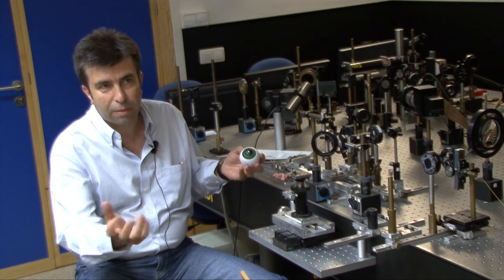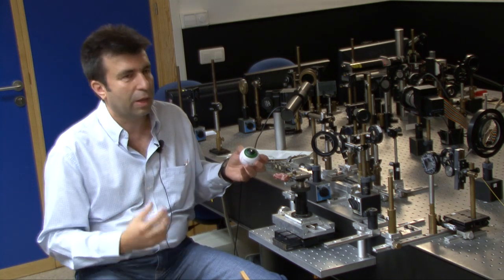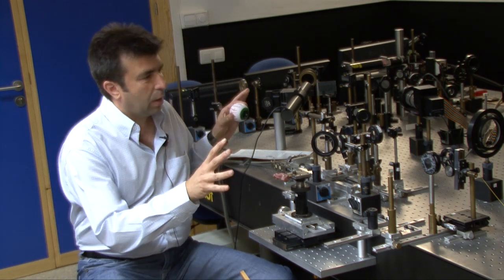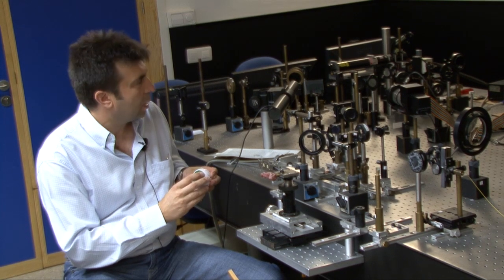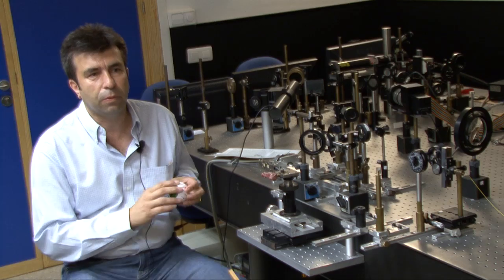Of course, you know how you are seeing, but how are other people really seeing? How is your grandmother seeing? How is your neighbor that is complaining about myopia doing? Well, we built a unique instrument, what we call an adaptive optics simulator, to really predict how people are actually seeing. I'm going to give you a tour of this instrument. I'm going to present some examples of how some people are actually seeing.